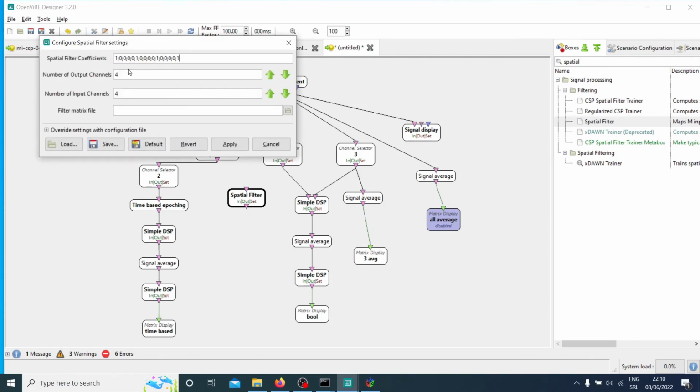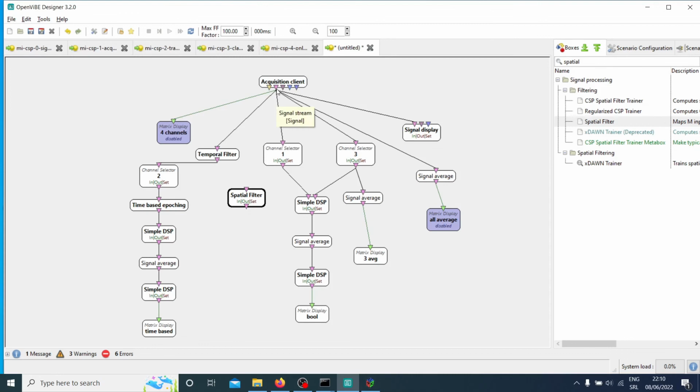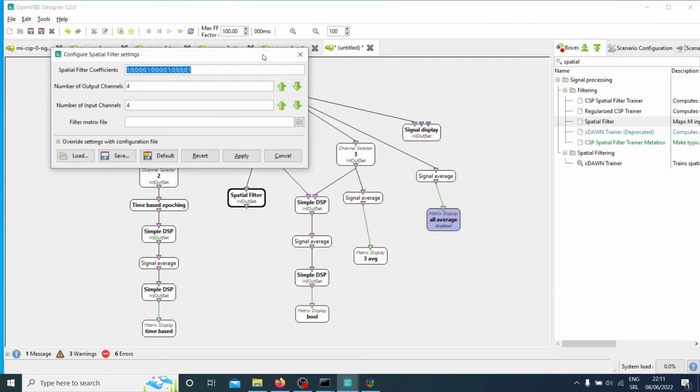If you look at this, it just means you have four input channels. Okay, it makes sense. You can have four input channels if you do that, right? But if I'm already selecting only one, then I'm only going to have one input channel. So you need to pay attention to how many channels you have in your input. By default here it says four, but you can change that. You can also send eight or whatever. So here you need to change that.